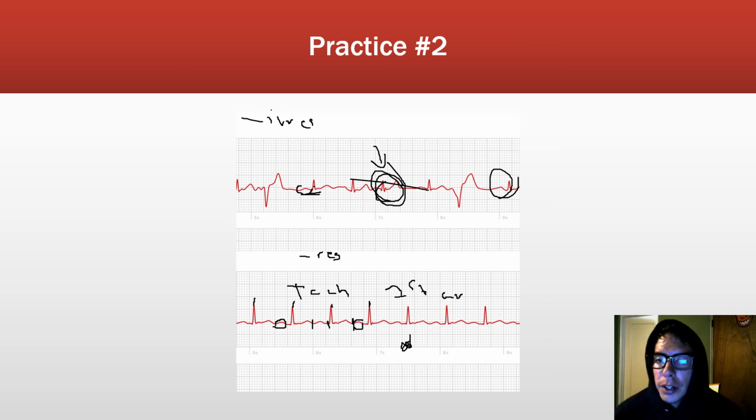So sinus tachycardia with a first degree atrioventricular block. And I don't expect you obviously to know the rhythms now. I'm just showing you what the interpretation is and what you'll be able to do eventually, but right now we're just focused on getting those numbers, those specific things, in order to determine what rhythm it is.